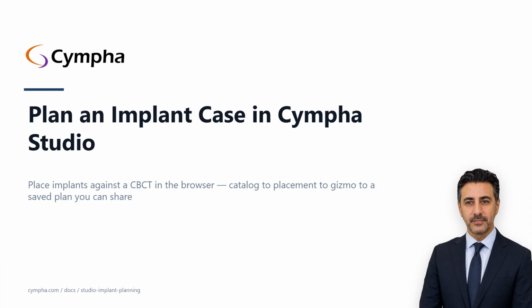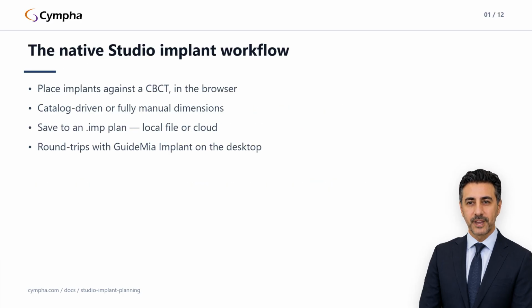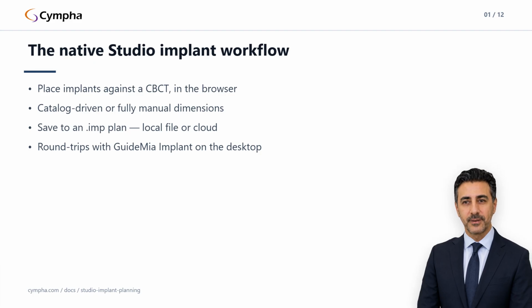Here's the lay of the land. Studio has a native implant workflow. With a CBCT loaded, you open the implant toolbox, describe an implant from the embedded catalog or by typing dimensions, and click it into place in the three-dimensional view or on a slice.